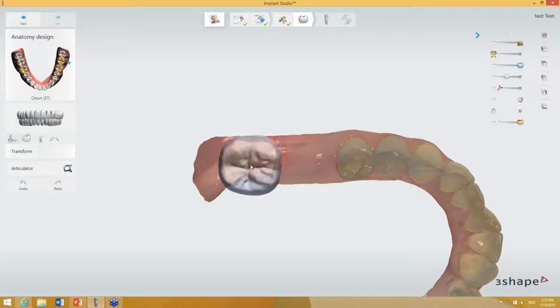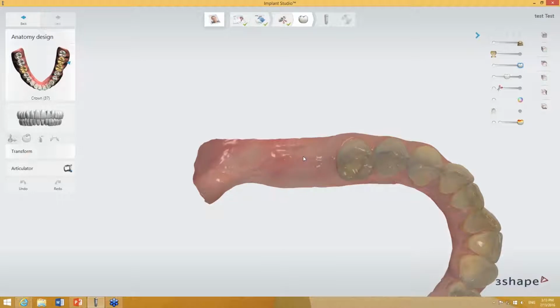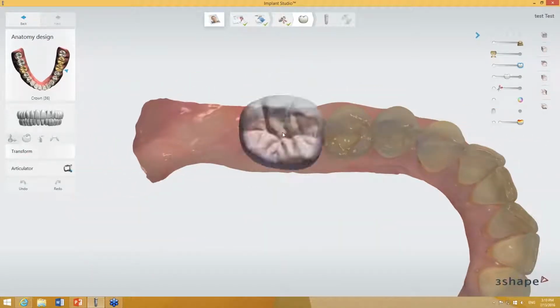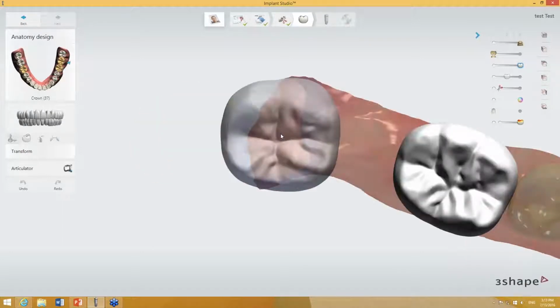Before I start placing the teeth, since software suggested that we should start with crown 3.7, I think I would prefer to start placing my teeth from crown 3.6, since I can place it really nicely close to the neighboring teeth. There's nothing easier to change that. Just go to the preview of the order form and the top left side, click on the tooth 3.6 and watch out because the orientation of the model might change. Find the right position and you can start placing your anatomy right away next to the existing teeth.